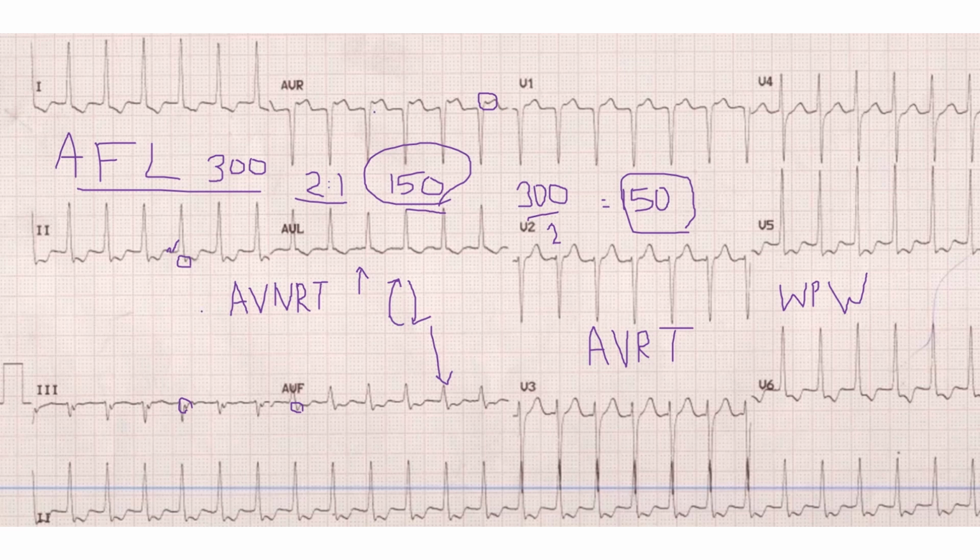There is a risk of cerebral ischemia while giving a carotid sinus massage. Then the person should be under monitor, and in case of severe bradycardia, you should be able to immediately treat it as well. So in a monitored intensive care like setting, that is a cautious carotid sinus massage. These are the important aspects in this ECG.